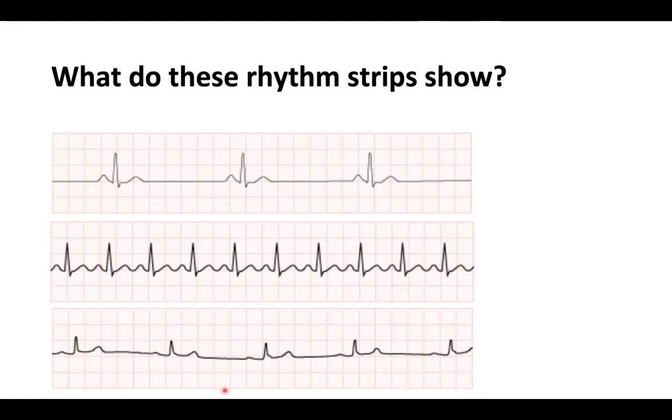Yeah, sinus bradycardia. And the third, bradycardia, no. Try again. Anyone know what the third one is? It's a bit tricky. Okay, I'll explain.